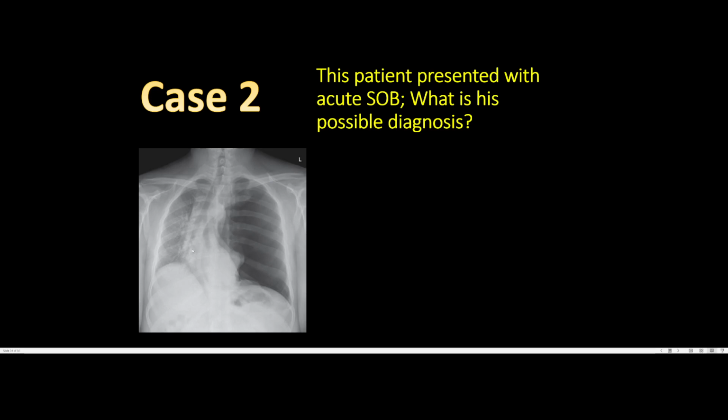And on top of that, you can see on the right lung field that most of the mediastinum has been compressed towards the other side, compressed contralaterally. So if you have a hyperinflated lung, and you are able to see the visceral line of the lung, but let's say you have a hyperinflated lung with absence of bronchovascular markings, and it's purely composed of air, and there's shifting of the mediastinum contralaterally, then you start to think that this is a case of tension pneumothorax, or left-sided tension pneumothorax in that case.